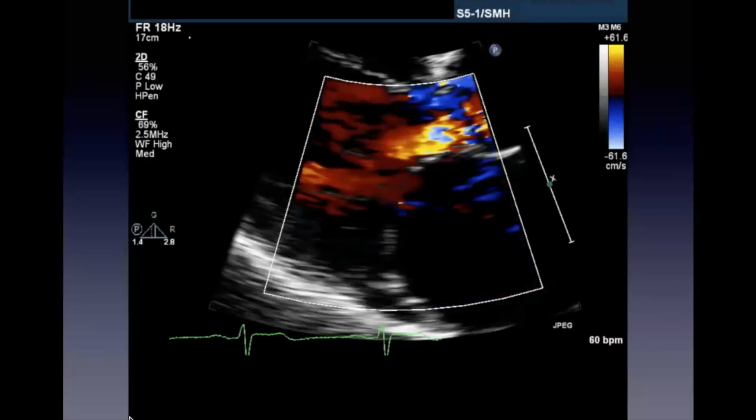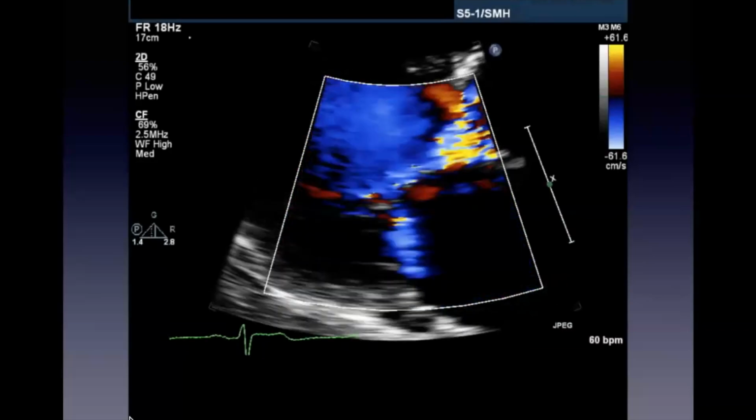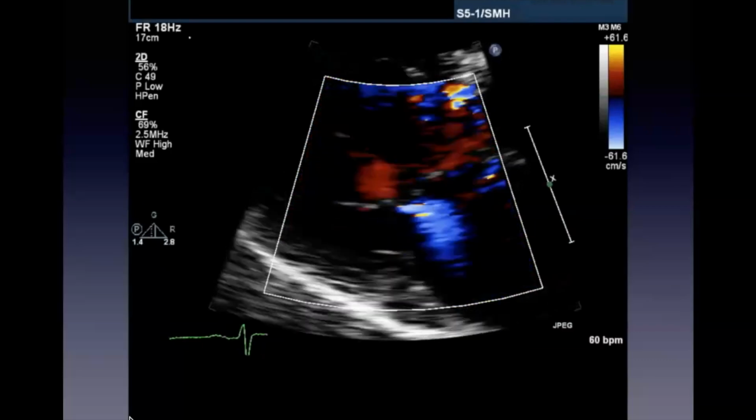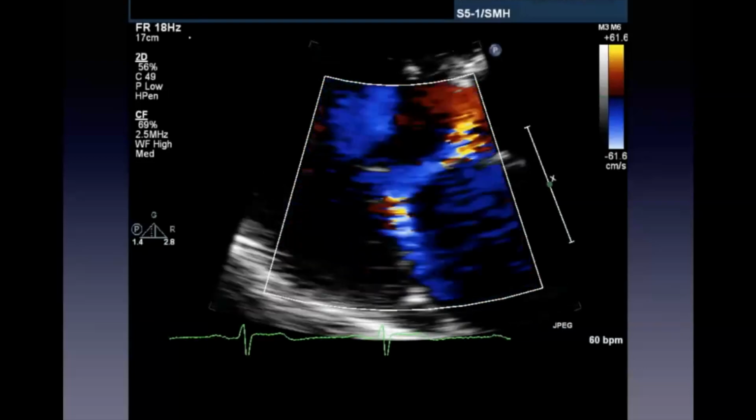I think this is like Jeremy's favorite echo thing. He talks about diastolic MR. I know Dr. Chow also likes diastolic MR. I like diastolic MR too.